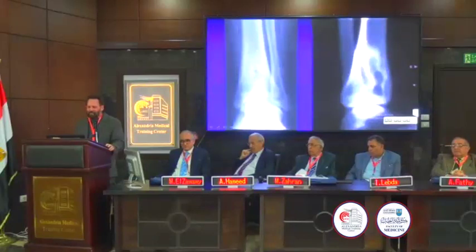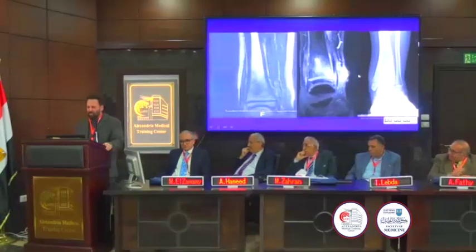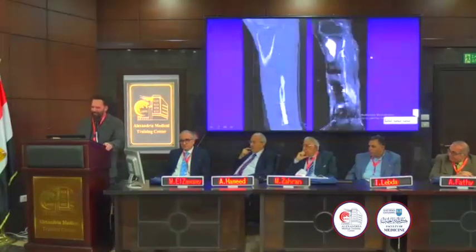Here's a Brody's abscess in the tibia, and you can see the tract down to the physis. A Brody's abscess in the ilium, been there for a long time with sclerosis around it. A non-ossifying fibroma, which is why we did the MR, interestingly enough, but has a Brody's abscess where they tract down to the physis. Having a non-ossifying fibroma was the best thing to happen to the patient.